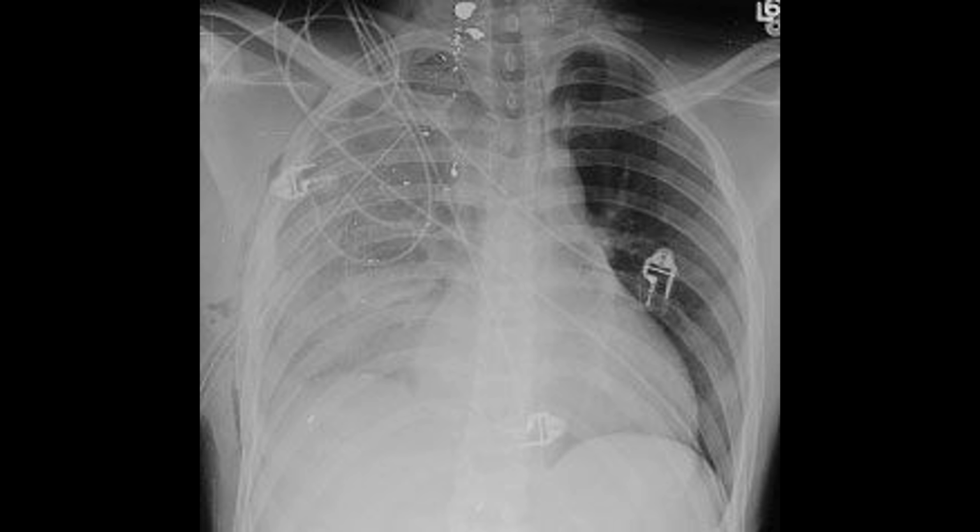After thoracostomy tube placement, the mediastinum returns to the midline, confirming decompression of the pleural space and resolution of the tension component. Although the mediastinal shift might initially suggest a tension pneumothorax, the mixed pleural densities are more typical of either a tension hydropneumothorax or a tension hemopneumothorax.